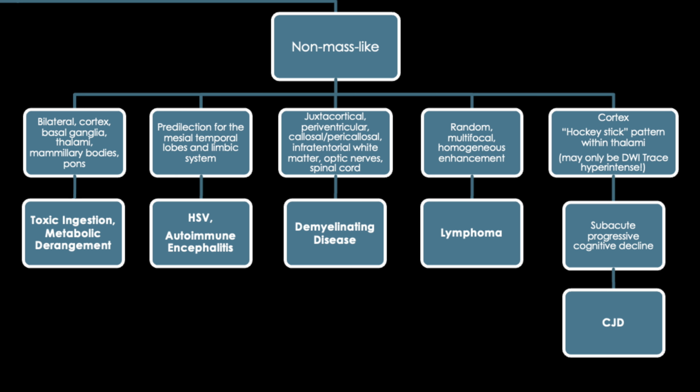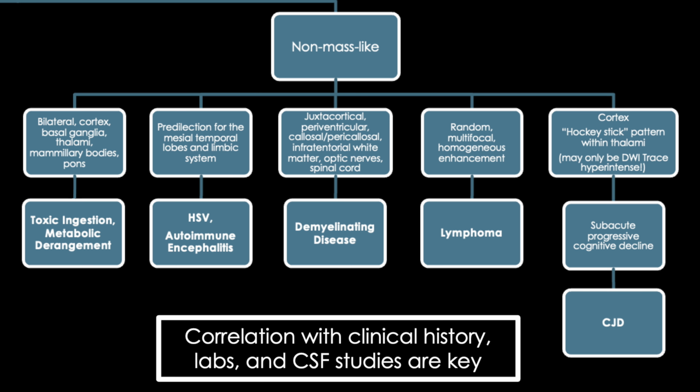If you find this all overwhelming, the good news is that because restricted diffusion associated with these non-mass-like lesions can be so varied in appearance, these findings will always need to be correlated with the clinical history, labs, and almost all will need a lumbar puncture for CSF studies.